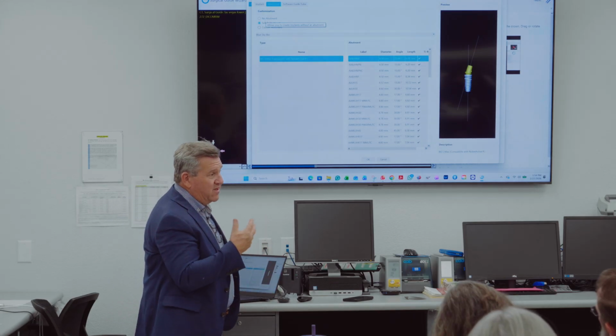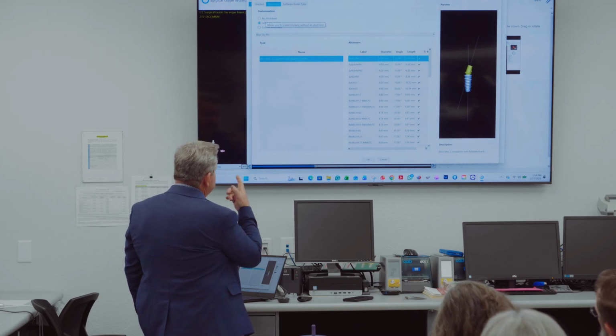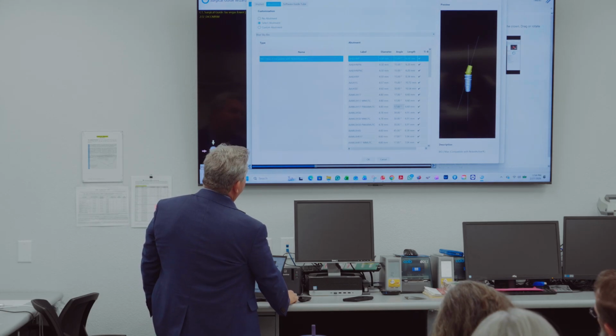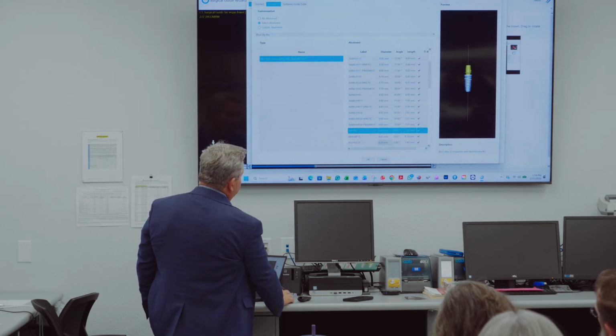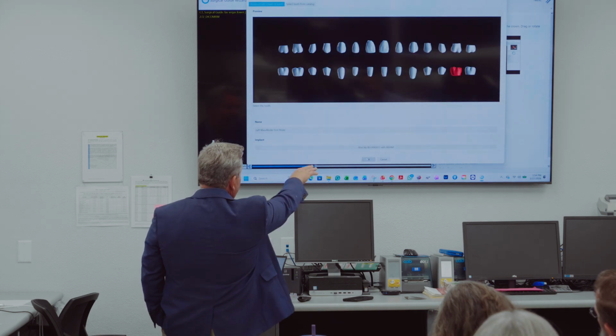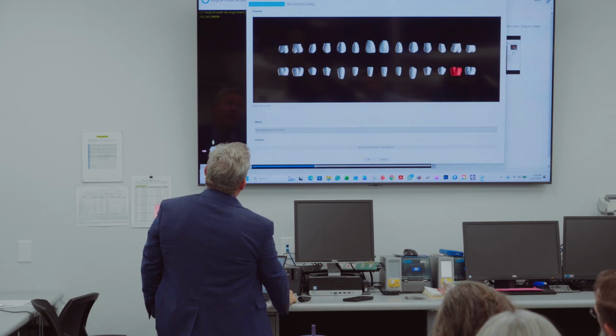But assuming you're going to temporize it, which is where we're going to go with this crown that we're going to build, that's where you choose it. So select abutment and get my implant. There we go. I want the straight one there. Okay, click OK. So now we have that implant, the left mandibular first molar, tooth number 19.